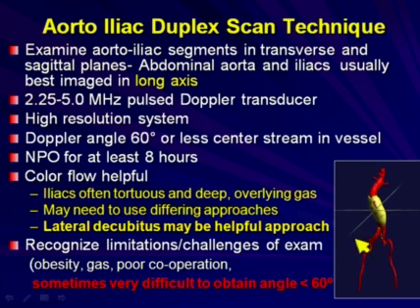This picture is a 3D reconstruction of a 1 millimeter CT, and you can see here that this is quite an angulated aorta, and you can also see how tortuous these iliac arteries are. Even though a standard axial CT would drop the plane this direction, we're able to put a plane in these CT scans in an orthogonal or perpendicular approach, and that's what we do with ultrasound to be able to accurately measure the residual diameter here.